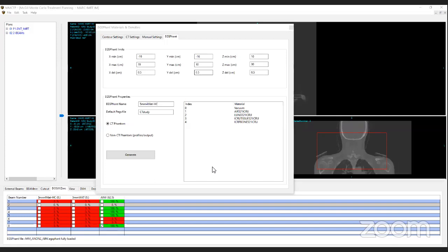Once you export in Precise, you have to make sure that you tick all parameters, because you will have checkboxes for RT structure, plan, dose, and so on. Make sure that all of these are ticked. Otherwise, the system will export only one type for you. It will be maybe only a DICOM image, or a DICOM plan without the structures. So make sure that you select all of these parameters before you do the export.